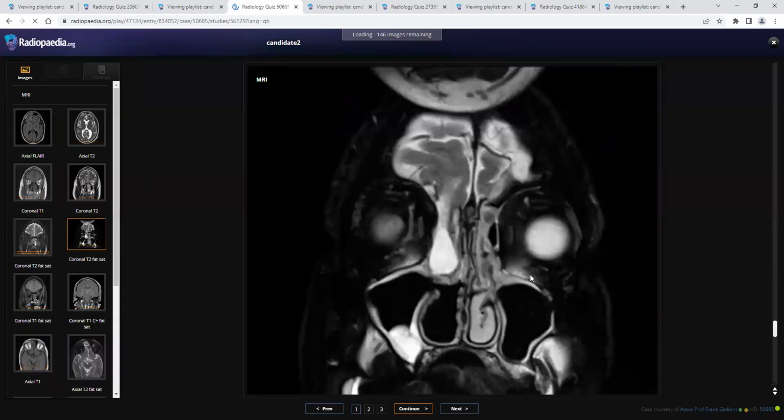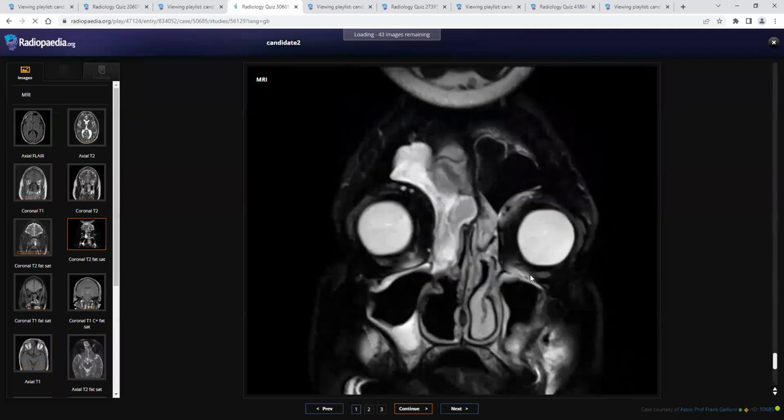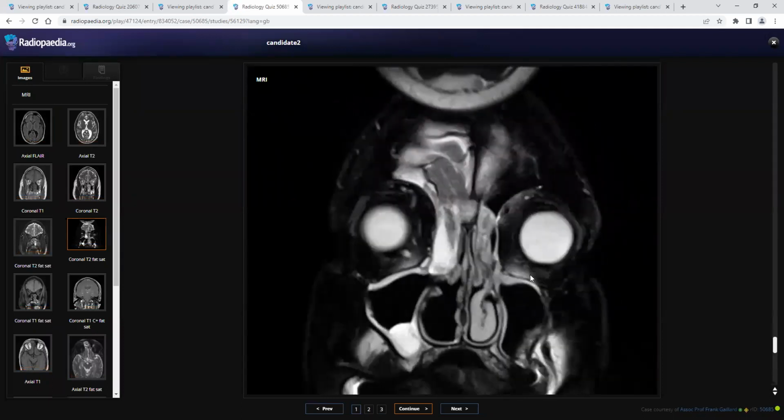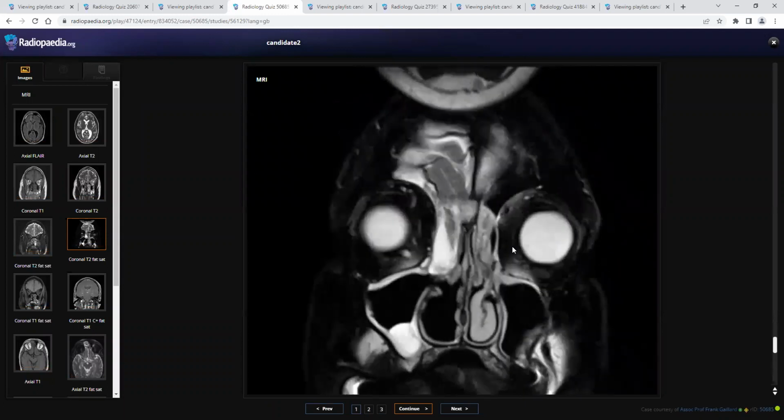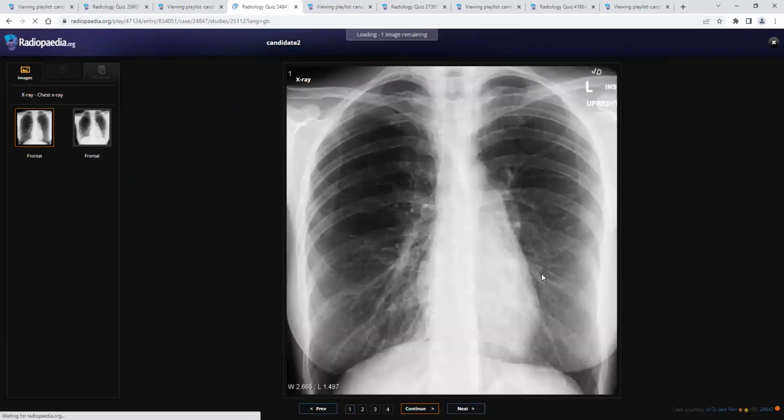And the previous one, this is an encephalomeningocele, through the defect in the cribriform plate and the herniation of the brain parenchyma. The patient had a history of trauma 2 years back. Okay. Good.